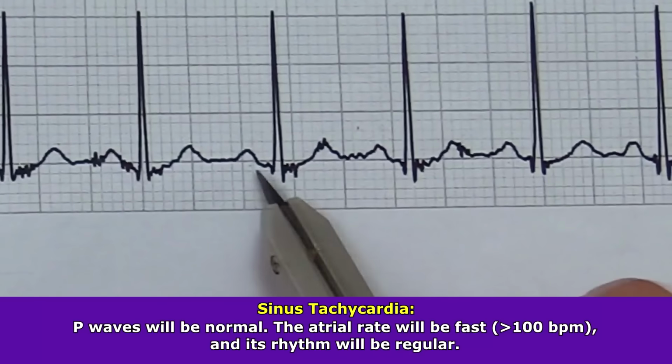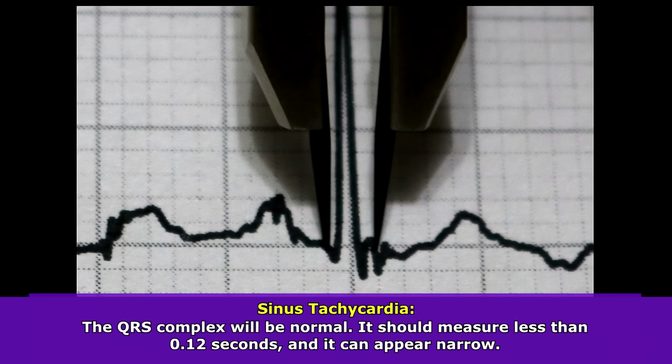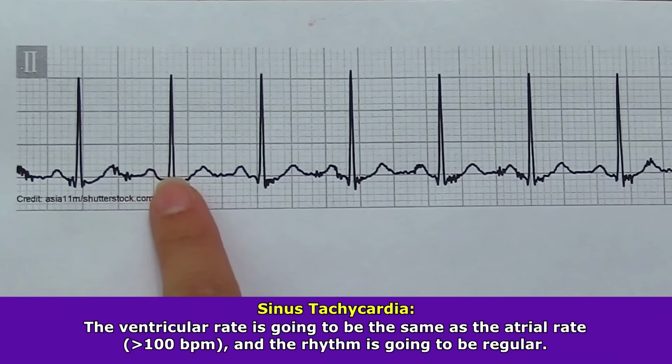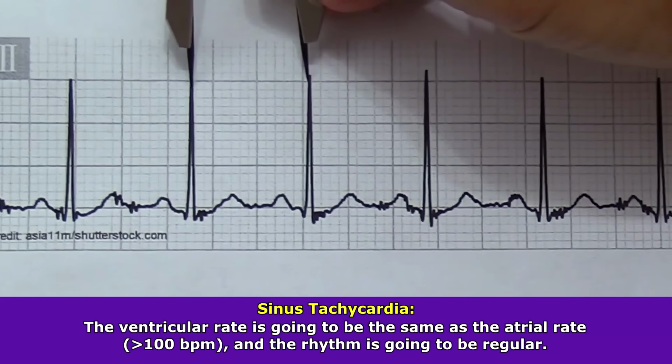So the atrial rate will be fast, greater than 100 beats per minute, and its rhythm is going to be regular. The QRS complex is going to be normal. It should measure less than 0.12 seconds, and you're actually going to notice it'll appear narrow, especially if the rate is fast. And our QRS complex tells us about the ventricular rate and rhythm. So the ventricular rate is going to be the same as the atrial rate, greater than 100 beats per minute, and the rhythm is going to be regular.